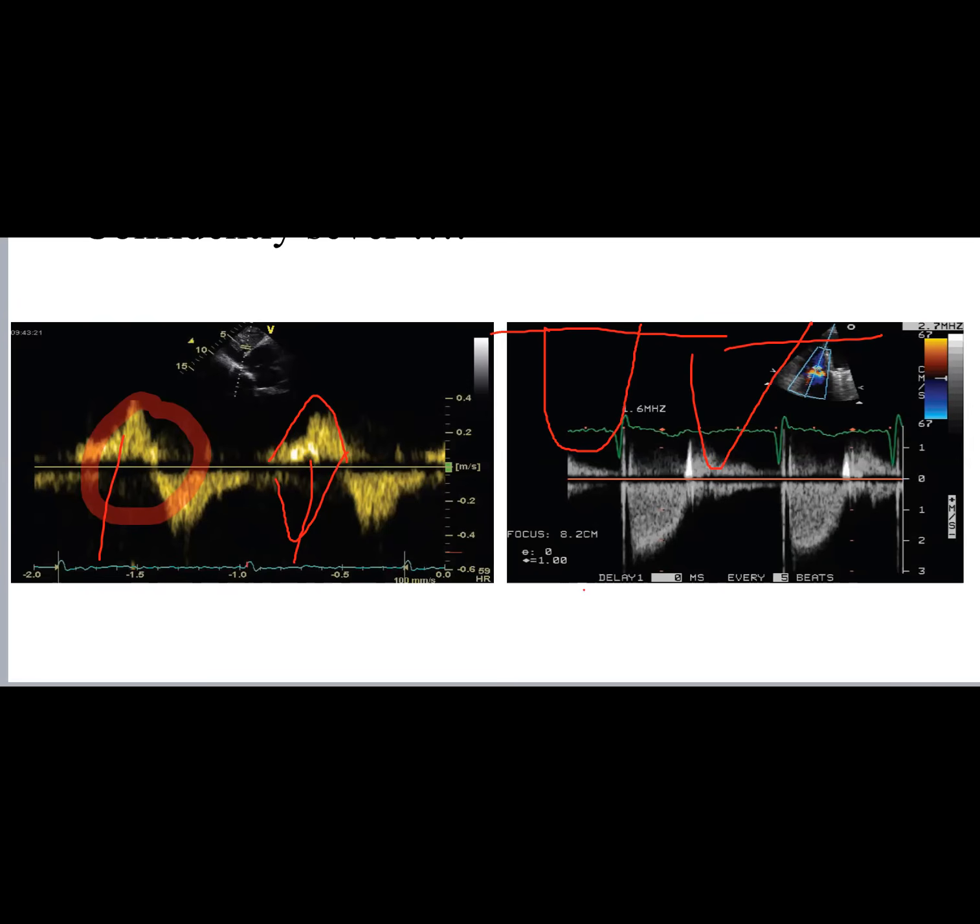Now, the density is also meaningful in terms of severity, but I have to be cautious, because the density is not only about severity, but also about whether you are striking the right alignment, where you are hitting, and the settings and all of that. Now, the other thing is the velocity here. Does the peak velocity of the TR have anything to do with severity? The answer is yes, no, or you don't know.